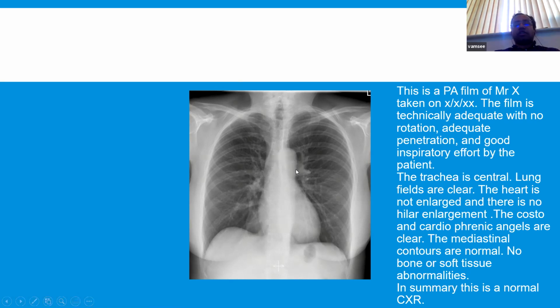One of the things mentioned with mediastinal contours is the aortic knuckle going along there and the aorta along there. You're also looking at the right paratracheal stripe, so this line here. And usually if you have any disruption or masses there, you'll get displacement of the trachea. But yeah, so the mediastinal contours are normal. Usually when we refer to that, we talk about the disruption of the pattern or widening of the mediastinum.